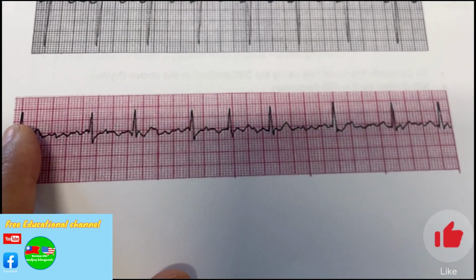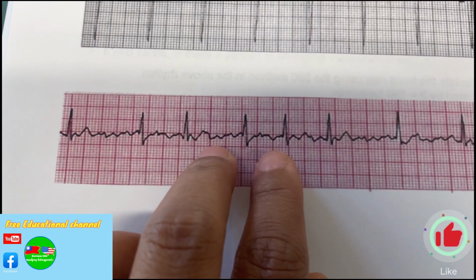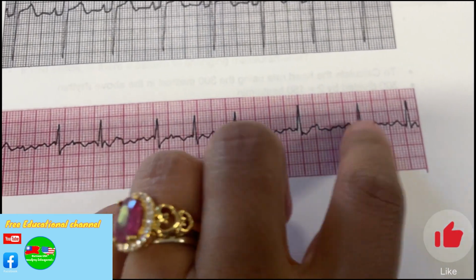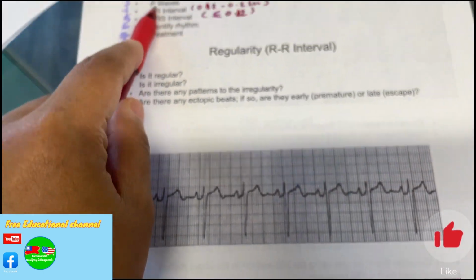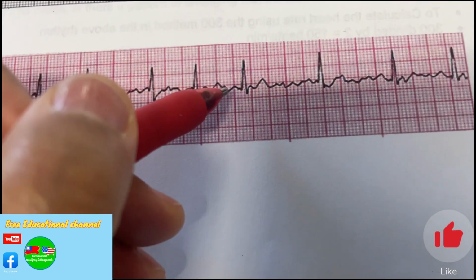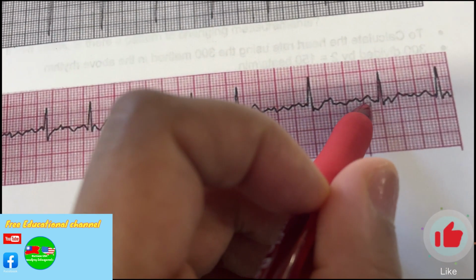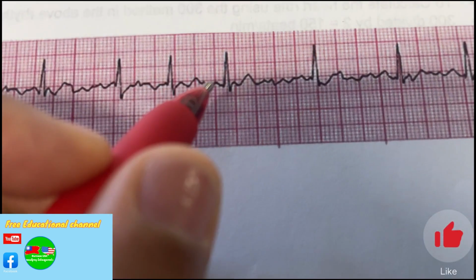And like this one, look at the rhythm. It's not regular, right? Can you see that? And the rate: 1, 2, 3, 4, 5, 6, 7, 8, 9, times 10, so 90. And look at P. Is that a P wave? You see there's a P right there before the QRS. There's a P, QRS, P, QRS, but it's not regular. But there's a P. And then the PR interval.